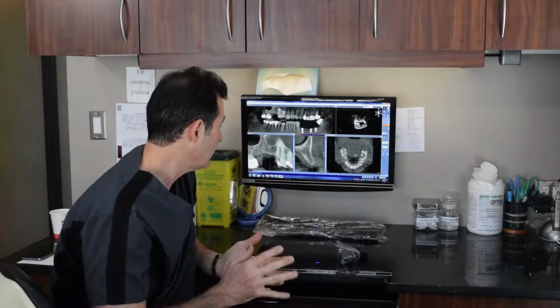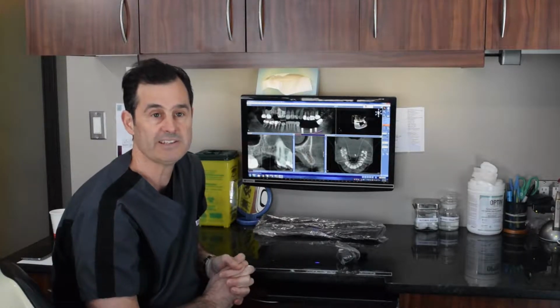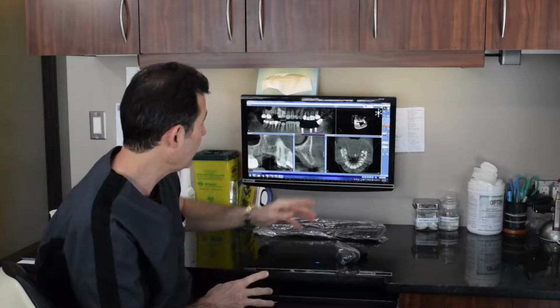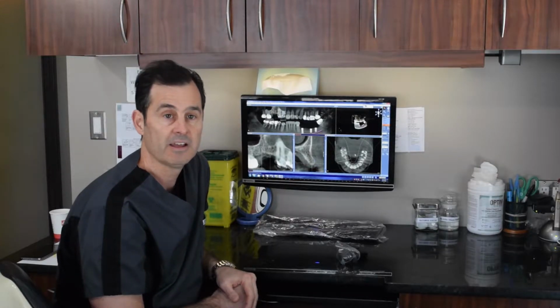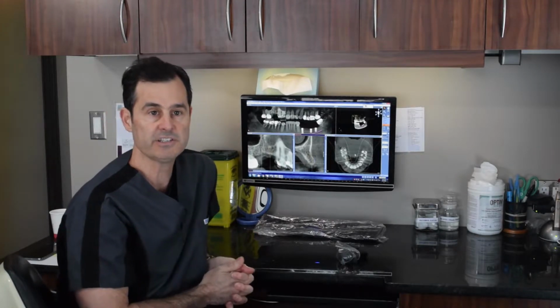So here I've showed you two different cases. The first one had tons and tons of bone, easy case we can put the implants into. This one is very lacking in bone, it's going to need some bone reconstruction, and it's high risk that we could hit the nerve here. So again, this surgery is going to require a little bit more care and a little bit higher risk. So those are the kinds of things that we use our CT scanner for.